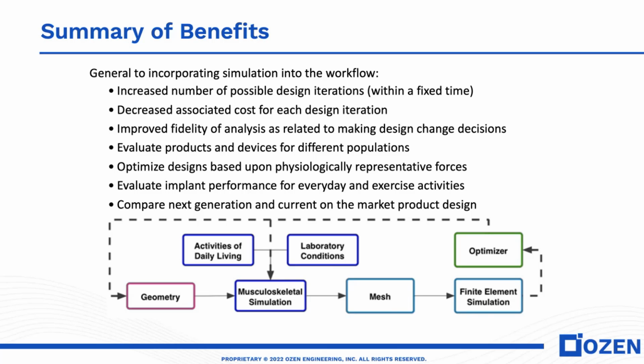And you can optimize design based on physiologically representative forces, evaluate implant performance for everyday and or exercise conditions. And you can create your own exercise conditions and or activities of daily living. And you can compare your own design with respect to what's available in the market.